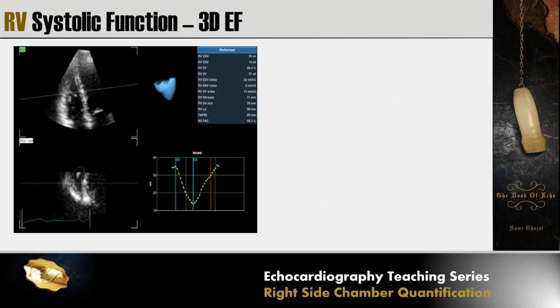The last method to estimate the RV systolic function is ejection fraction, and the only way to do ejection fraction in the RV, because it has a complex geometric shape, is 3D and 3D only. So we need to have a 3D software. It's a little bit time consuming and needs experience. However, it is accurate. The normal RV ejection fraction is 45% and more.